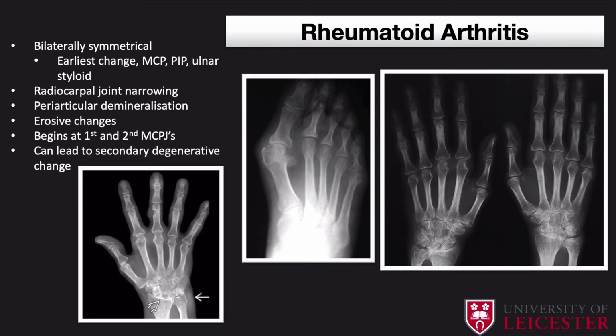The hand and the feet have the earliest involvement. Look out for all the subtle changes that you can see within the joints, particularly these subtle erosive changes. As I mentioned, you get periarticular osteopenia. In the early phase, this is all juxta-articular. Later, you tend to get it more diffusely. In addition to the erosions, you get cartilage destruction. Subchondral cystic changes are a frequent finding, but not always specific to RA, as remember, you may actually get these changes in osteoarthritis as well.